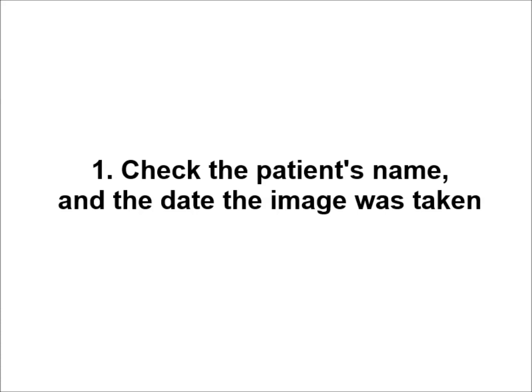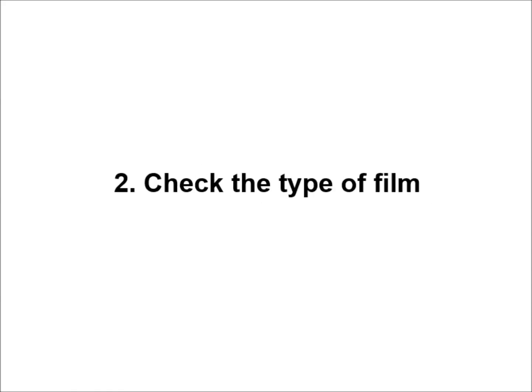Some patients share the same name, so it's also good practice to check the patient's date of birth or hospital number. Many mistakes are made because people overlook trivial details such as these. 2. Check the type of film.